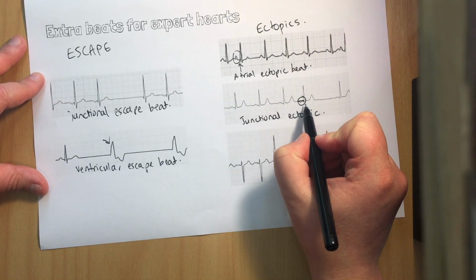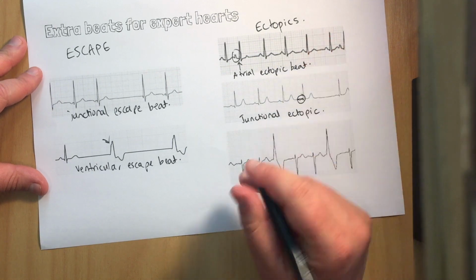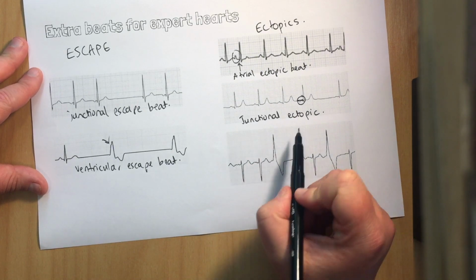It's certainly not a kind of normal looking P wave there, but let's just say that there's not a confusing wee bit there to confuse us. Confuse me anyway. I'm new to this.